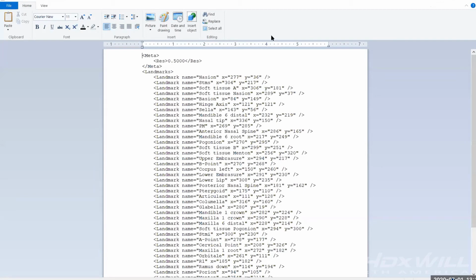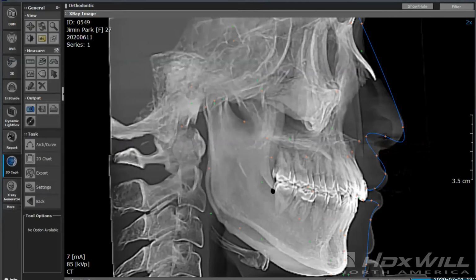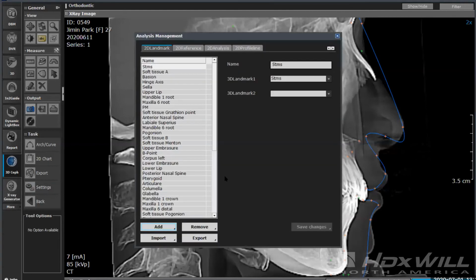It may come out better in Word, but the idea is that you can record those, and immediately when you export it, you're not only going to have the image, but you're also going to have all these points, not only in coordinate planes, but also the angles and everything else of that nature. When we go into settings, what's nice is, as we said before, you can choose points that are what you're used to choosing.